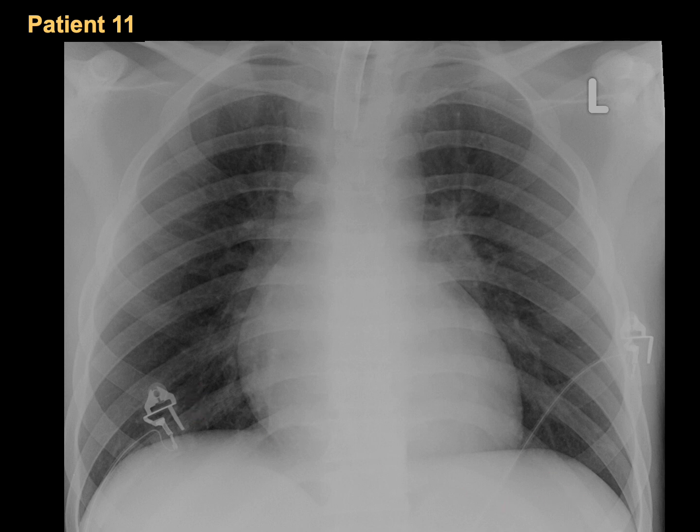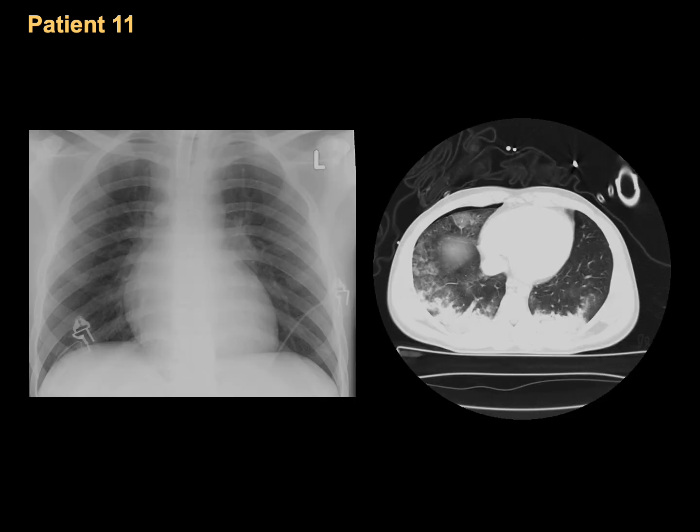And I want to tell you that when we did a CT chest for this patient, this is the cut at almost this level. If you look here closely, you will find that there is a rim of pneumothorax on the right side, and you might not be able to see it on the x-ray initially, because when the patient is in the supine view, you will not see the very well demarcated pneumothorax in the lateral aspect of the chest, because it will go ventral, like here in the anterior side of the chest, and it will be a very thin rim, and you might miss it.